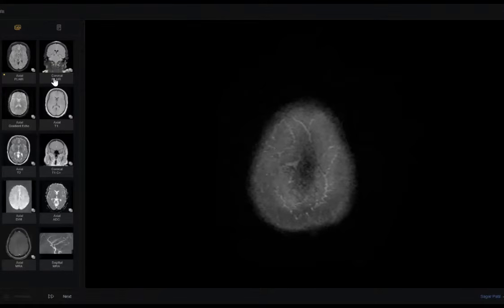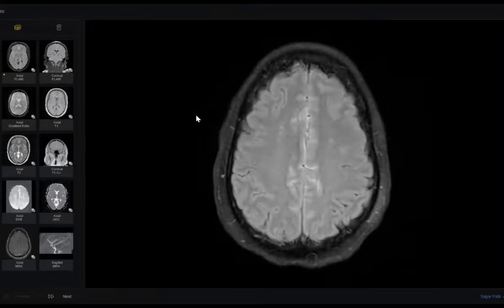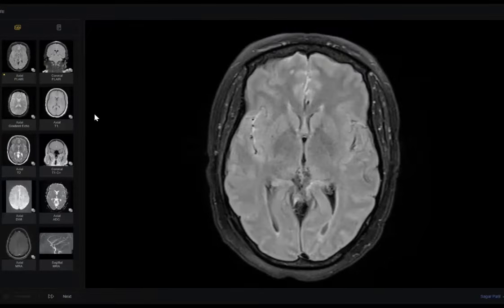The physician asked for MRI, and this is the MRI. Which sequence do you want? I would like T2. Do you think T2 is the best sequence to detect bleeding? No, FLAIR. FLAIR is the best sequence for bleeding. What else is the best sequence to detect bleeding? Blooming, SWI. SWI, okay, and GRE.